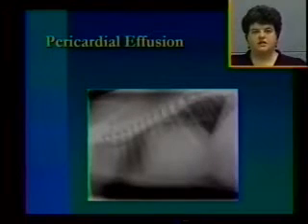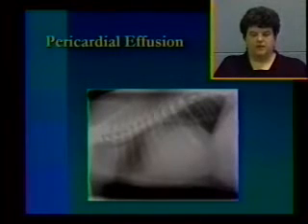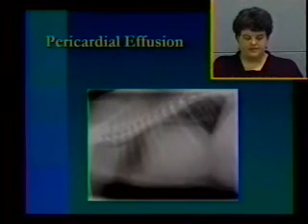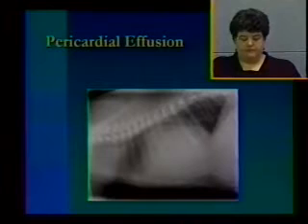Just a pericardial effusion dog, so that you can have a reminder of what it actually looks like. It's the big globoid heart with the rounded margins. Its trachea is parallel with the spine in this case. It takes up a large portion of the thorax and silhouettes with the diaphragm.